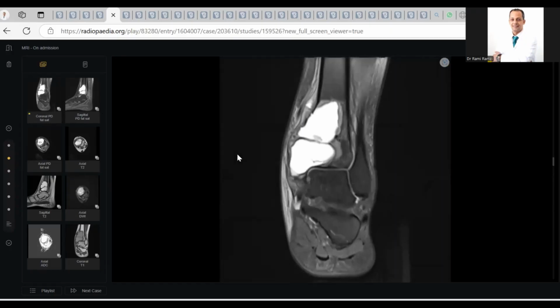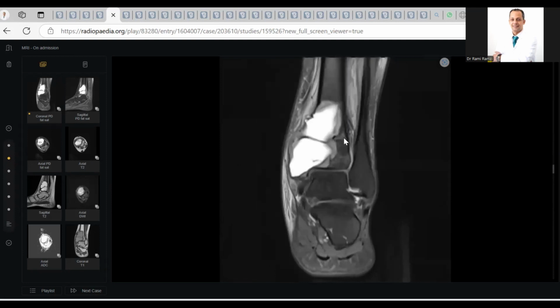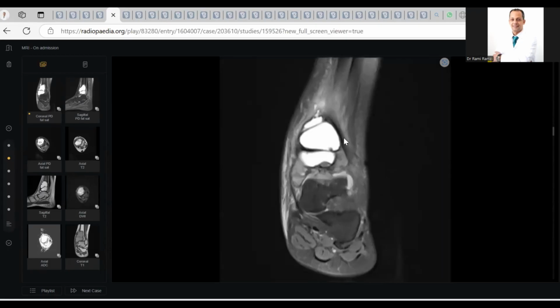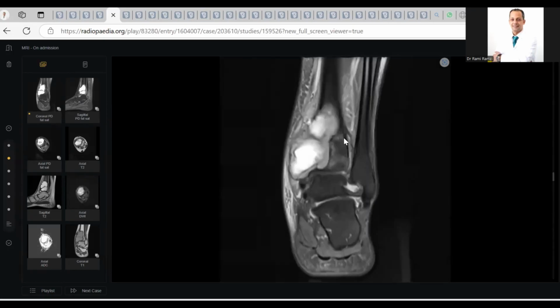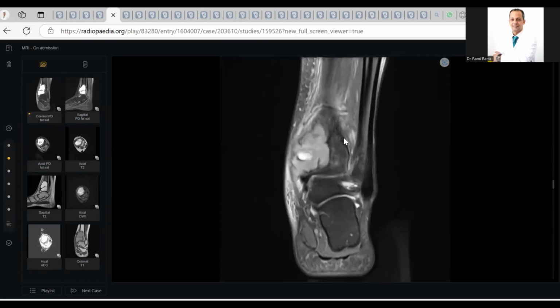So, and second point, you didn't talk about this cortical break. Take care, my friends. There are many fine details you can collect marks from it. The exam case is almost a usual case, but as you know, stress destroys many of our information. What is our next step?